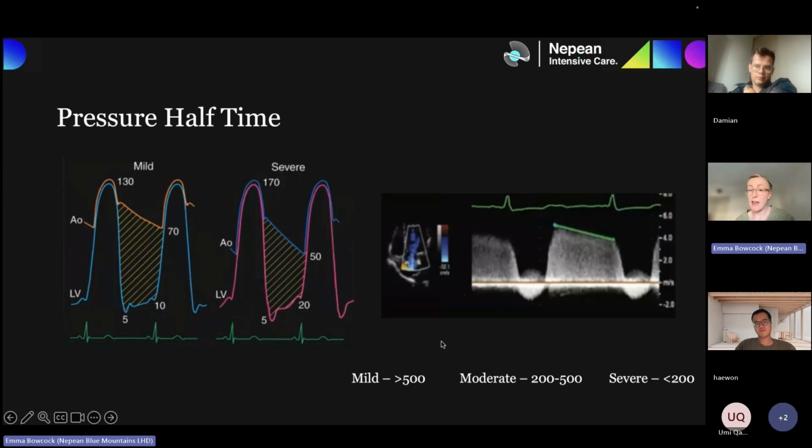But can you think of any reason apart from the volume, the regurgitant volume, which is how we're quantifying the severity of the AR, aren't we? It's like how much regurgitant blood is going back in mils. But if you look at these two pressure time traces, your LV in pink here and your aortic, your art line tracing in blue, what other things would bring these two pressures together quicker, apart from just the volume of blood? I think people misunderstand this actually, so I'm going to spend a little bit of time emphasizing this. I mean, like loading conditions, like afterload?